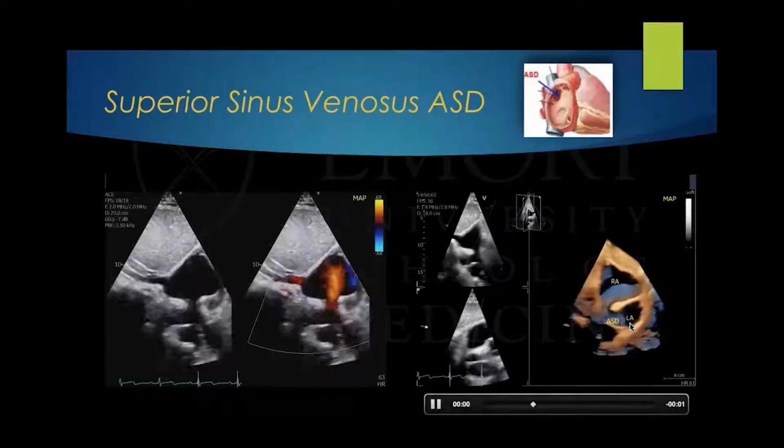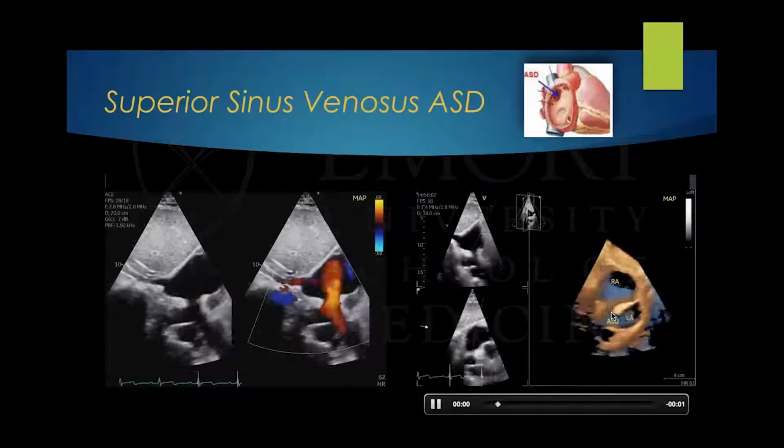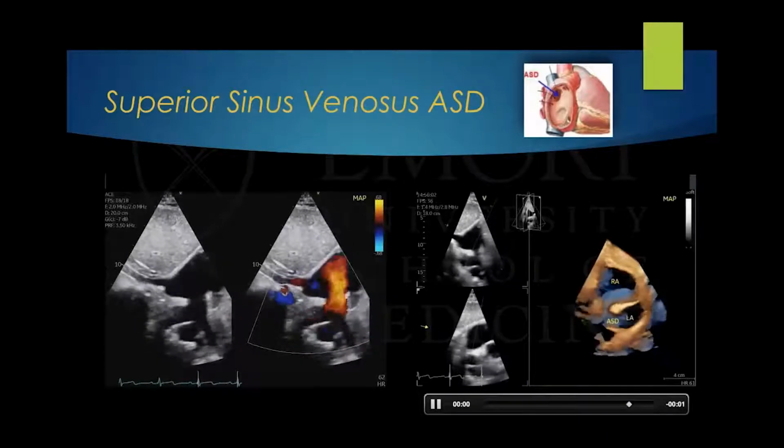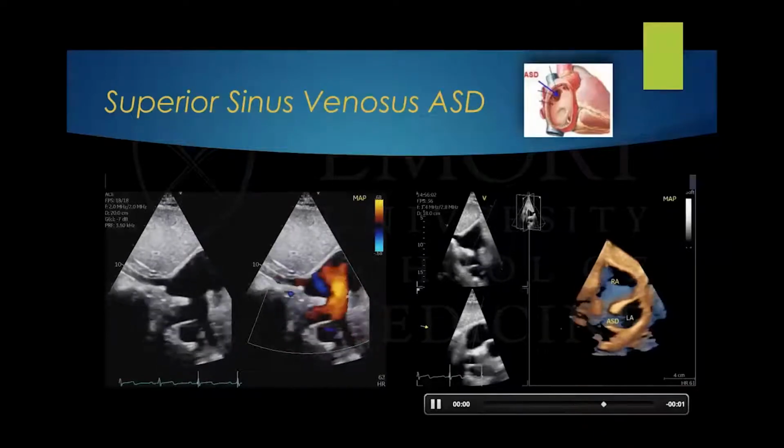And in this nice 3-dimensional imaging, we can appreciate the defect along the left atrium, the right atrium, and the SVC.